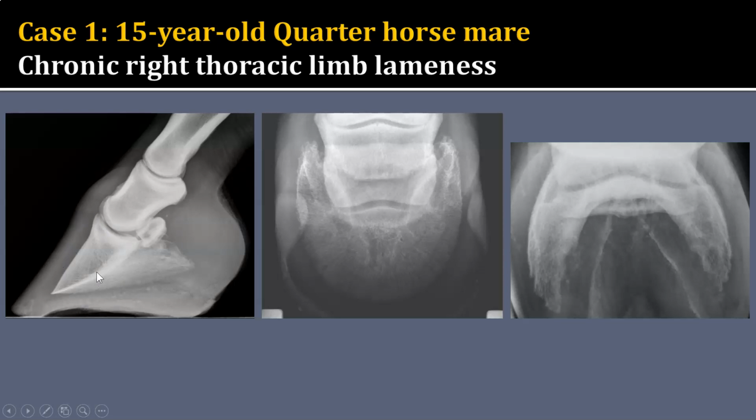Very normal distal phalanx, normal parallel cortex to hoof wall, and normal clarity of our hoof soft tissues. So this patient has findings that would be of severe navicular degeneration, and because of the flexor cortical erosions, most likely has navicular disease. But again, we'll clinically correlate that.